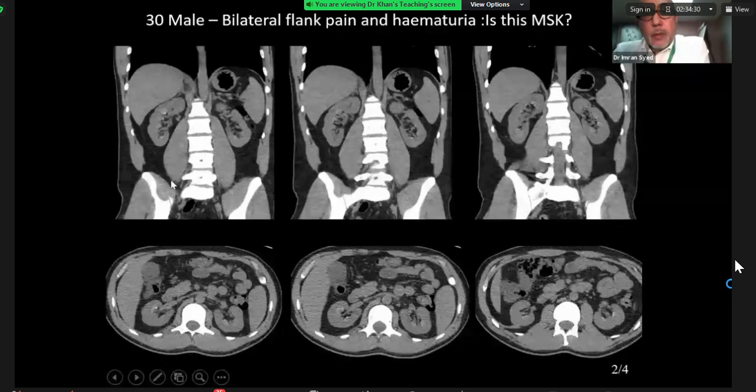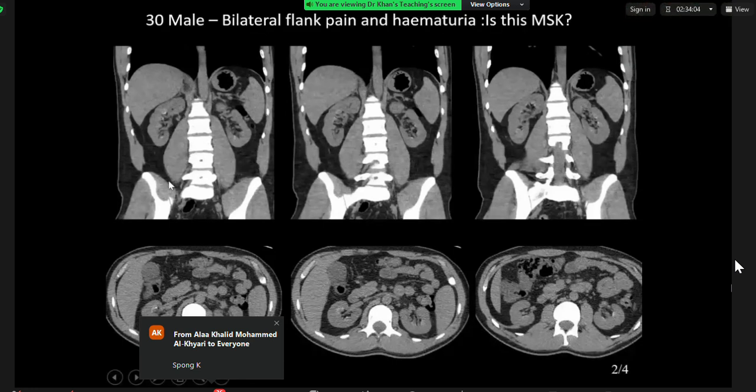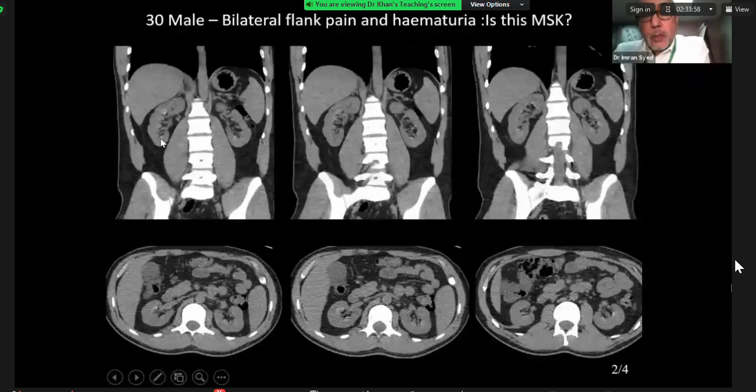Okay. So if I was to point out the calcification here being just above the concavity of a calyx, where would that be? Similar appearances here. What would that location be known as? Is this medullary or cortical, therefore? I think if it's outlining the calyx, it'll more likely be medullary. Correct. So this is medullary nephrocalcinosis. Just as a reminder to me, is cortical nephrocalcinosis more or less common than medullary?